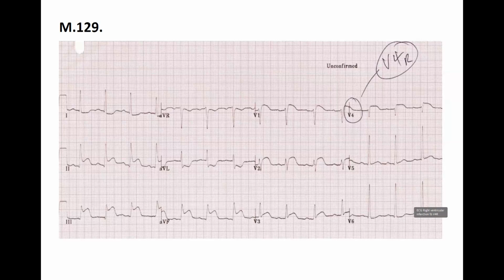I would say it's rather rhythmic, around 100 beats per minute, because I counted about three squares. Yeah, 3.5, a little bit more than 3, so it's less than 100, but it's okay.